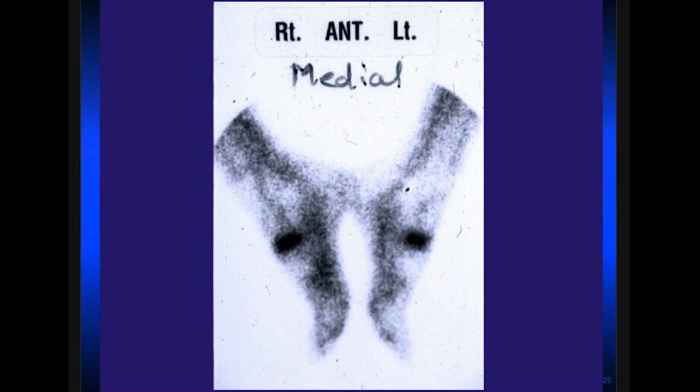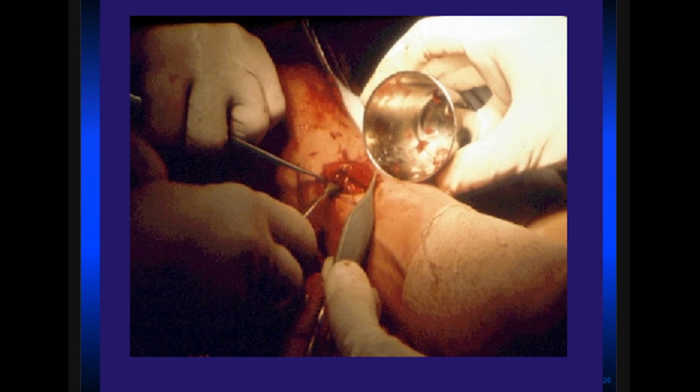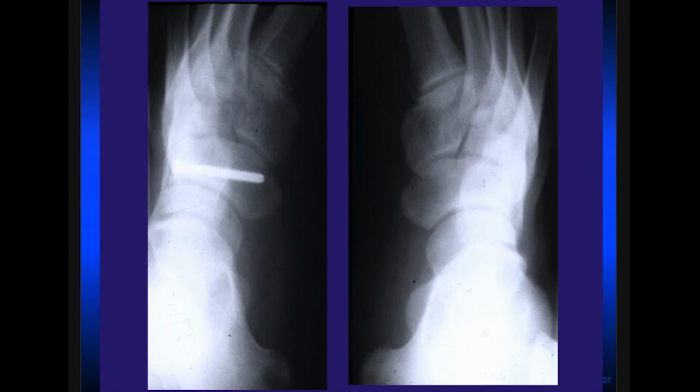She was having more symptoms on the left, so that's what we did internal fixation of. And this is her x-ray. Local bone graft was done, 1 screw, and you can see here where she's healed. Fortunately, the other side healed. She was in a wheelchair for a while, did well in school. Her freshman first semester fall, didn't play for that year. She ended up doing okay. So image early with midfoot pain to rule out a navicular stress fracture.